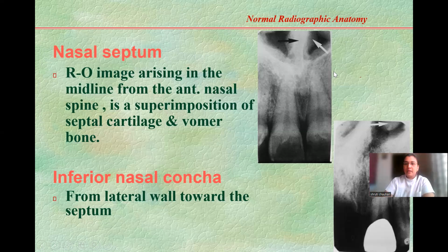Now, the lateral fossa. It is also known as the incisive fossa, a gentle depression in the maxilla near the apex of the lateral incisor. It is at the apex of the lateral incisor and is diffusely radiolucent. This is this area. It's the lateral fossa here, the side part of the nose. There's a depression, so that is why it is called that.